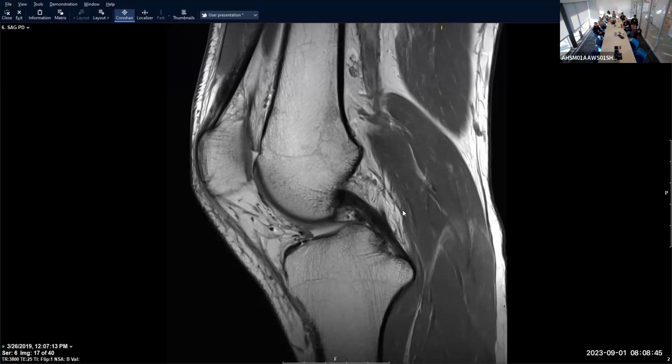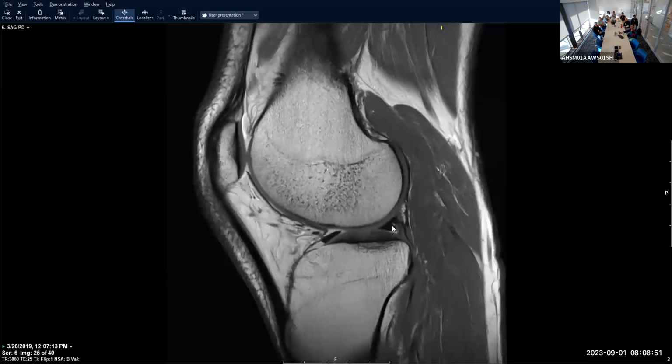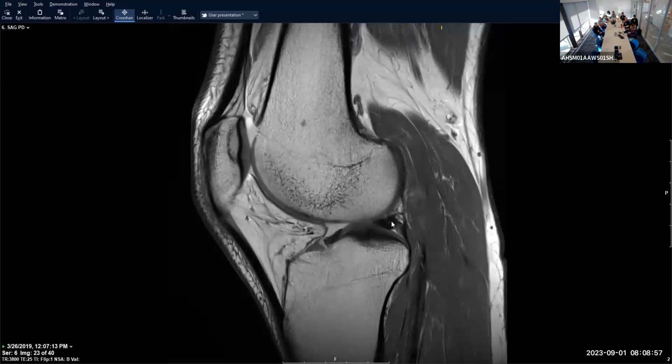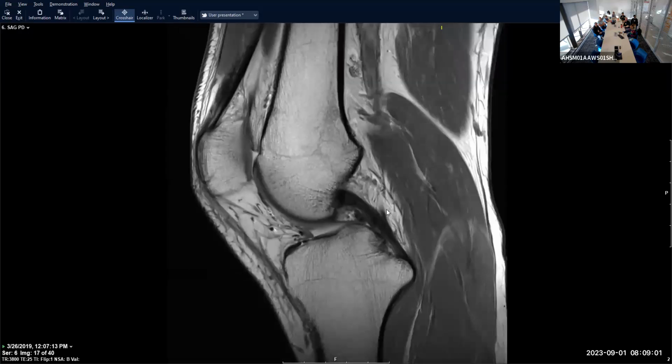So you get this ripping traction on the lateral meniscus posterior horn where this attaches, and you can get vertical longitudinal tears. One of the more commonly missed meniscal tears is a vertical longitudinal tear at the periphery of the posterior horn lateral meniscus from this ripping, in the setting of ACL tears most commonly.